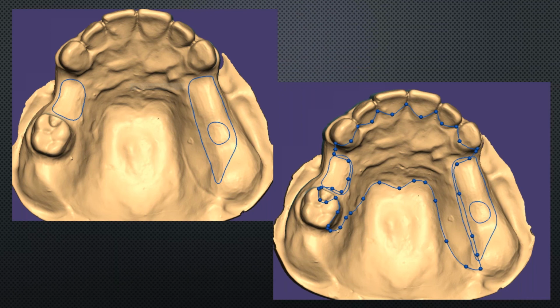Or you could process the whole saddle in Duraflex as well as the clasps. There's just so many options to make, for every situation with a lot of these materials. So you mark your major connector, your rest. You can mark your rest secondarily or kind of wax it in with some of the tools that Exocad has.